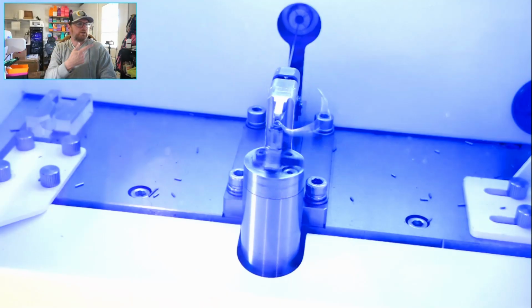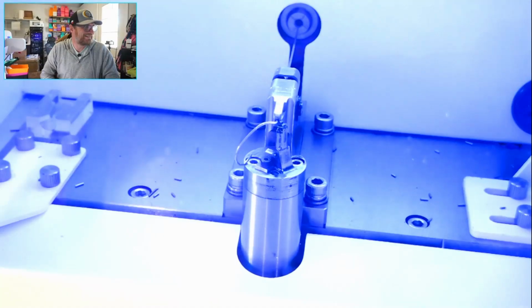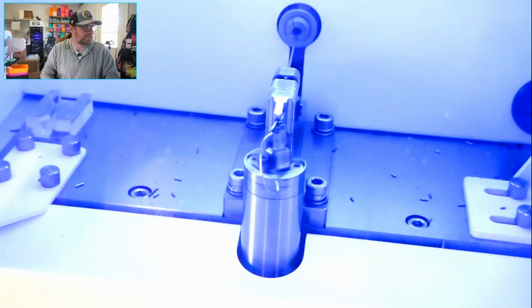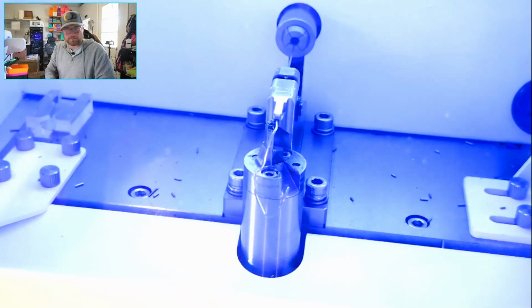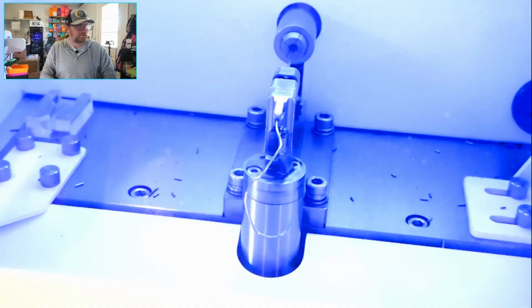If you're wondering what I'm looking at over here, yeah, this is messed up. This is totally messed up. We're just gonna let this get done, and then we'll rebend it. It just lost where it was. Boy, I really messed that up. That was my bad. Don't touch the back of the cords. I was messing with the cords to turn on my light over here.